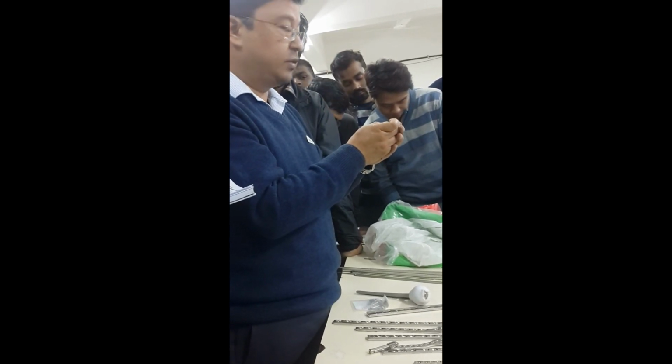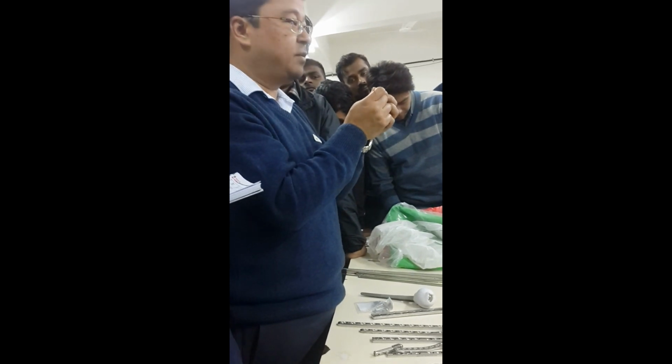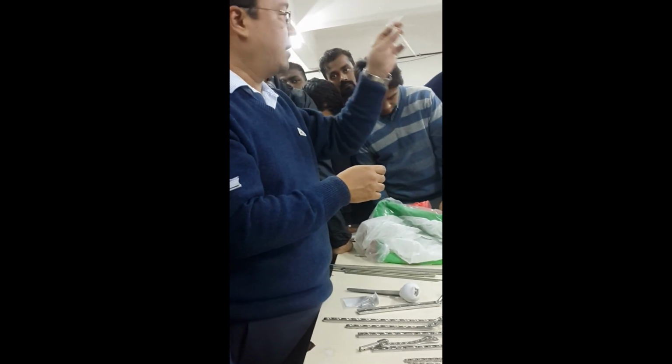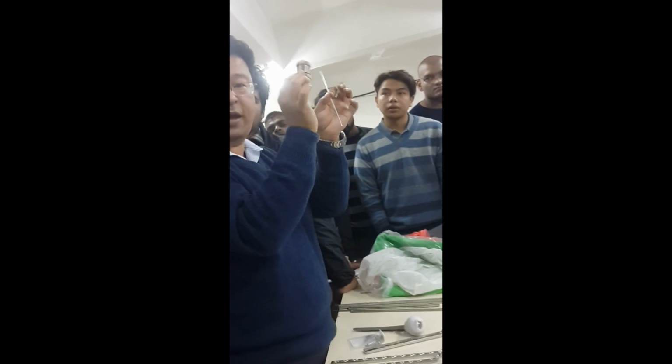There is the supracondylar fracture, cross K wire, lateral condyle, and tension band wire. Tension band is a definite treatment. Where is tension band applied? Patella and olecranon. For the tension band wiring, you have to have a K wire and the coil of stainless steel wire. You use this to put a tension band wire.